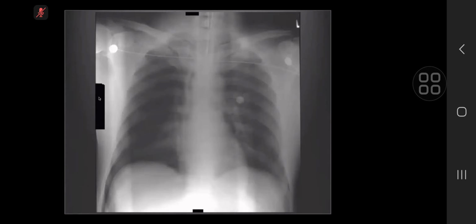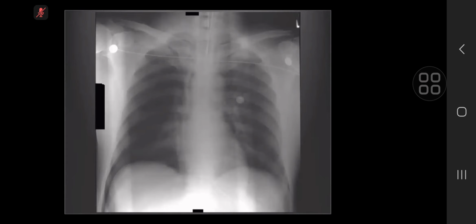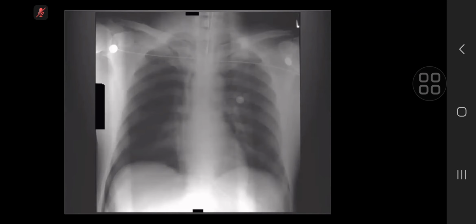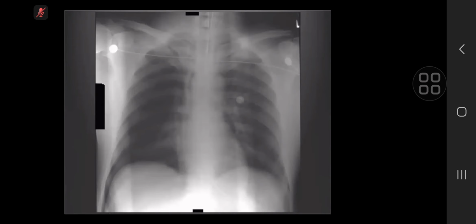So again, I've got a frontal radiograph on which I can see there is a difference between the transradiancy of both lungs. The right lung appears more lucent, and I can see a line projected over the right mediastinum, which conforms to the shape of a vessel.